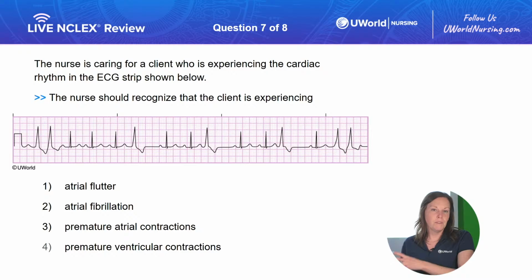There are a lot of dysrhythmias that can happen, but some are brought to the attention of the test taker to know. So we walk through what a normal strip looks like, and then based on that foundational knowledge, we talk about where the dysfunction is happening in our heart and what that translates to on the electrical presentation of everything.